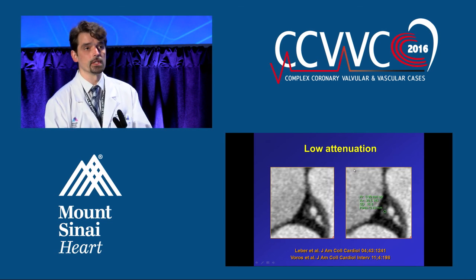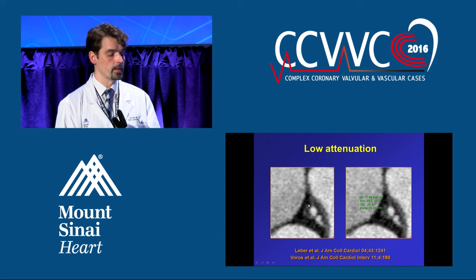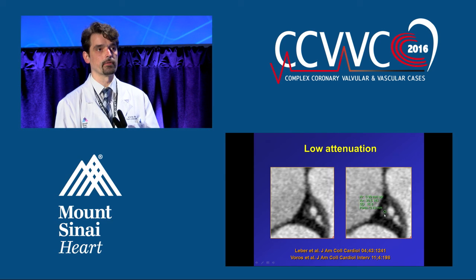Another very important feature is low attenuation. So if you look at this plaque here in this cross-section, you can see there's a dark area here. We measure the attenuation, which is, in this case, 20.5 Hounsfield units. So when it's less than 30, this is a very specific sign of a lipid core, because the lipids have lower attenuation, so they look darker than other tissues.